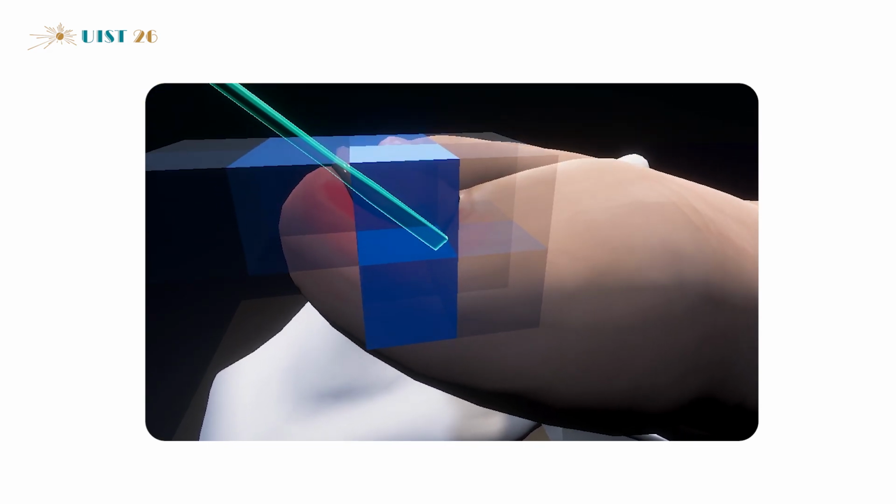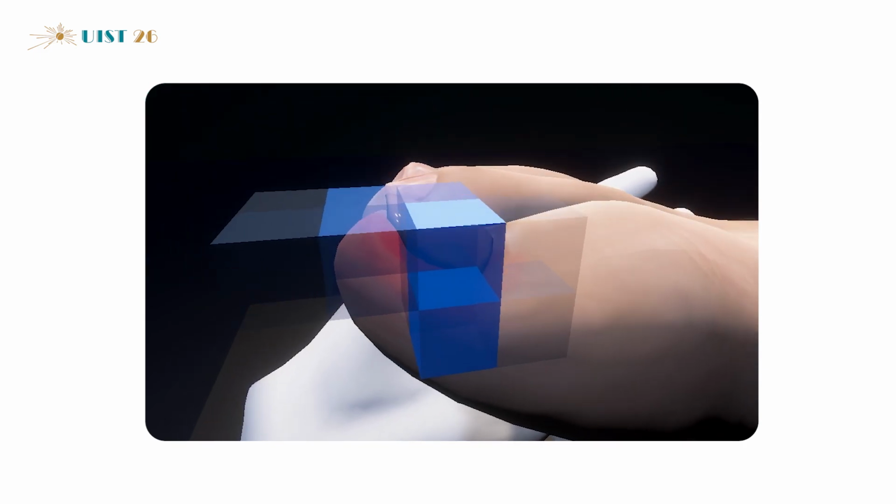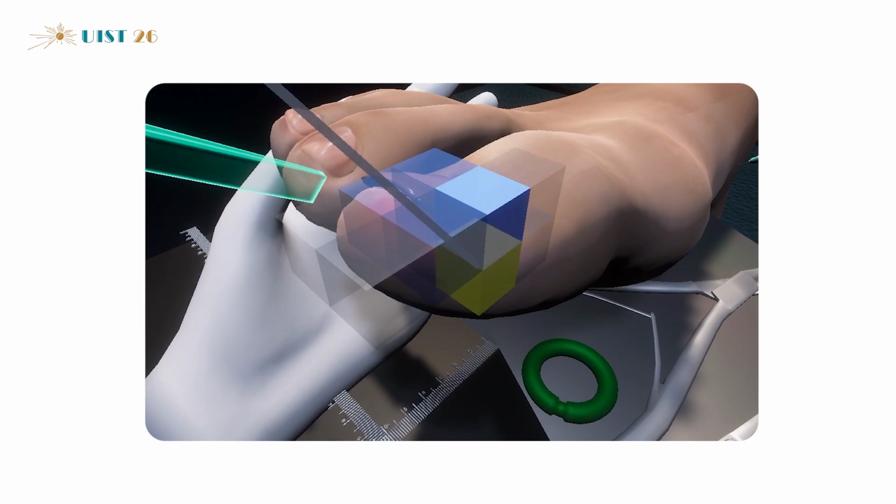The same voxels can be revisited during a single attempt. Repeated interactions update localized evidence in those regions. This makes the representation more spatially grounded and more informative for post-attempt review.